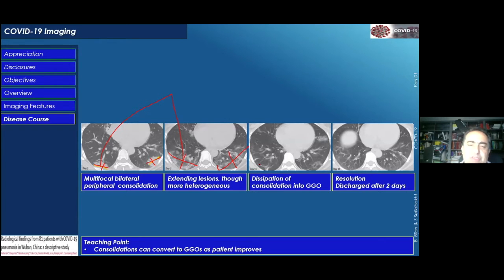Most of these lesions are like an explosion. It's a consolidation which explodes and ends up in multiple smaller infiltrated areas like this one, and then by time it just gets absorbed and they go away usually. So in this case, as you see here, this is one of the lesions that are literally exploding in the patient, and they're going to basically absorb very soon.